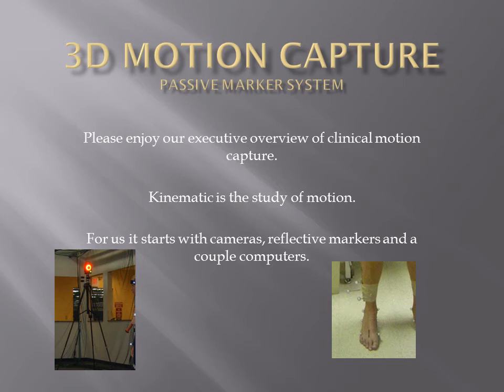Welcome to BioMotion's executive overview of clinical motion capture. Kinematics is the official word for the study of motion. For us, it starts with cameras, reflective markers, and a couple computers.